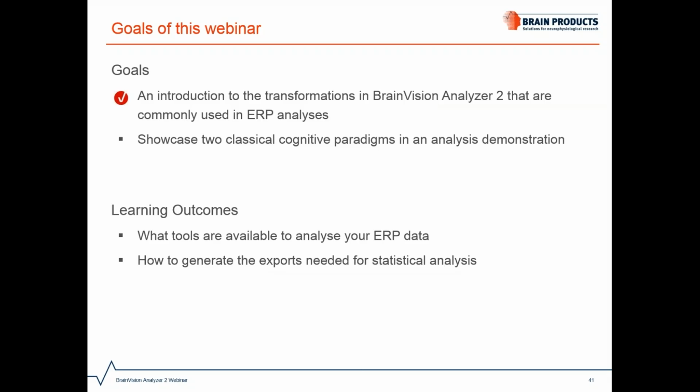They were, of course, fairly easy ones. I'm sure many of you use more complex stuff, but I hope that you could still profit from checking these pipelines together with me. Our learning outcomes for today were that you get to know the available tools and also that you learn how to export data for your further processing outside of Analyzer, may it be statistics or additional graphic processing or whatever.